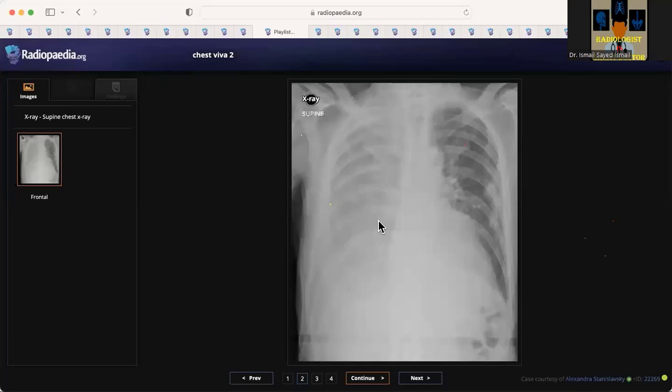Whenever you see lung markings through the density, that indicates that the abnormality is adjacent to the lung rather than within the lung. So that makes it unlikely to be a consolidation. This is just a pleural effusion in a patient who is supine. It just gives this homogeneous, diffuse appearance. Just be aware, always note the label of the X-ray, and the mediastinal shift away from the whiteout makes it a pleural effusion. Look at the underlying lung markings, as they will tell you whether the changes are within the lung or not.